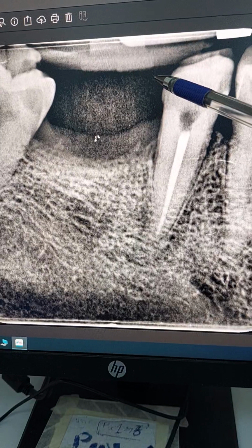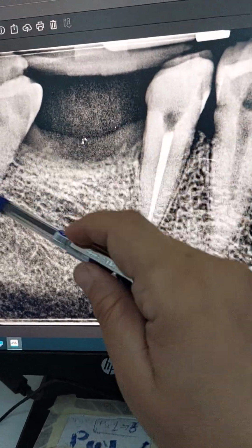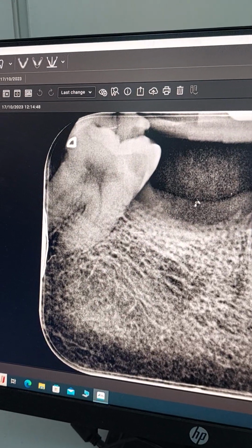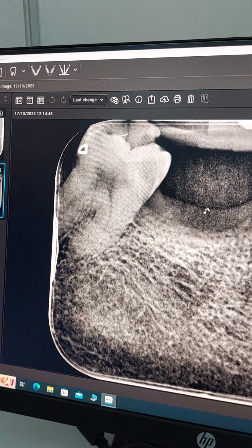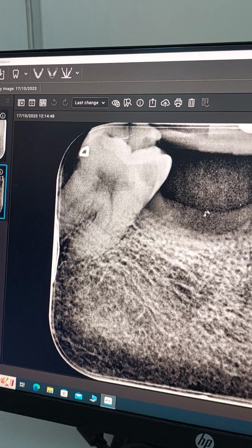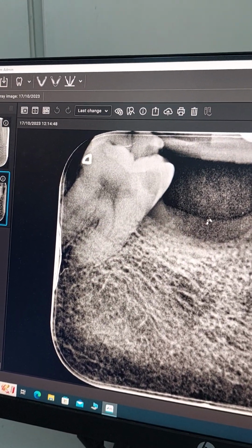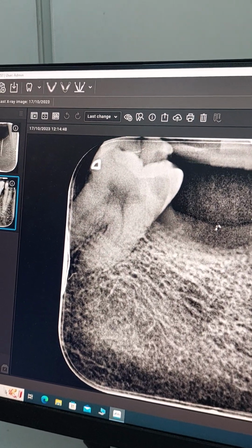Now I want to ask you a question. Okay, which tooth is this? I'm still with the identification of the teeth. 7. Do you say it's a 7? Yes, I think so, because it has two roots. Two roots. Okay. I feel it's a 7, wide crown.